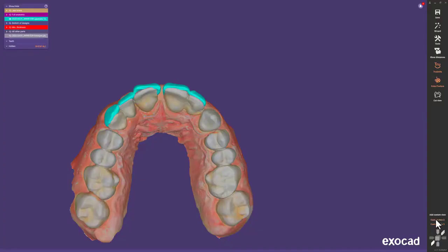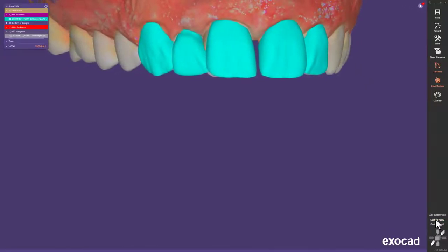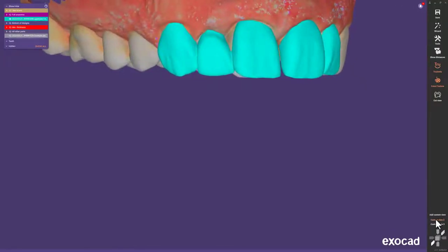At the same time, Rijeka provides a guided scan data alignment feature to make sure that objects show up in the correct position.